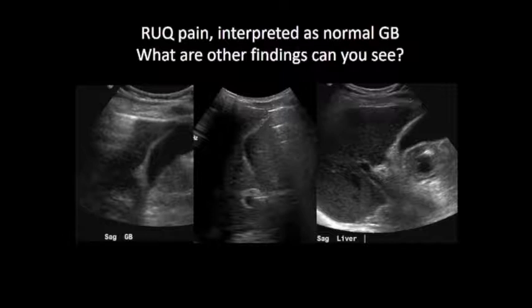And I looked at the images and I said, did you have a difficulty doing this study? And he said, you know, I didn't want to say, I was a little embarrassed, but yeah, it was really hard. I had a hard time seeing the gallbladder. And looking at this, what strikes you as a little bit odd here? Why did I even think he had trouble? Well, if you look here, there's all this sort of fuzzy shadowing where the edge of the liver is.